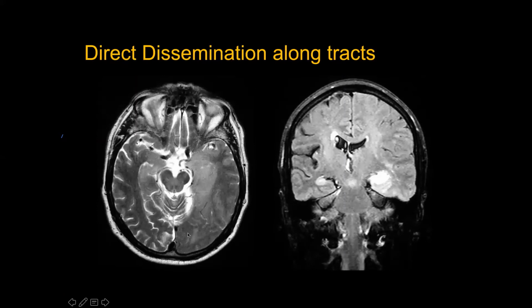And on the same side, the tumor is also extending anteriorly along the mesiotemporal lobe to involve the amygdala. This kind of appearance can only be due to glioma. Nothing else does that, actually contiguously infiltrating the brain. You look around here. Even here, there's signal abnormality going to the corpus callosum. Okay, only a glioma will do that.